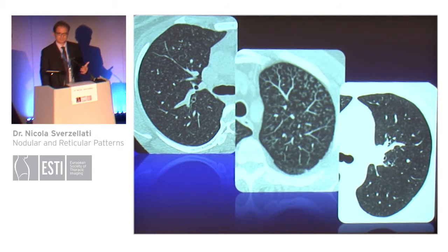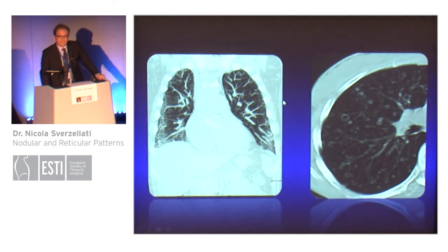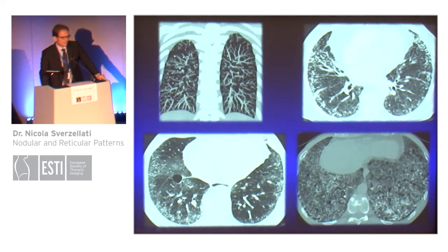For example, fluffy centrilobular nodules generally are consistent with respiratory bronchiolitis in smokers, and respiratory bronchiolitis signs are a common finding in smokers, or hypersensitivity pneumonitis, according to the clinical scenario. Tree-in-bud opacities generally reflect bronchial disorders, and the diffuse, sharply defined nodules are generally associated with granulomatous, immunologic, and even neoplastic disorders. Calcification and cavitation are also important features that must be assessed systematically and improve and narrow the differential diagnosis.